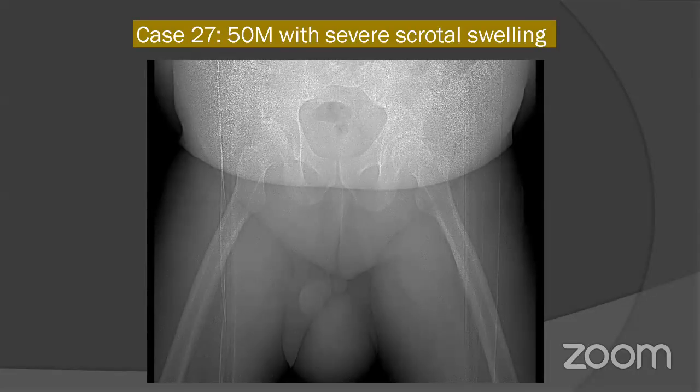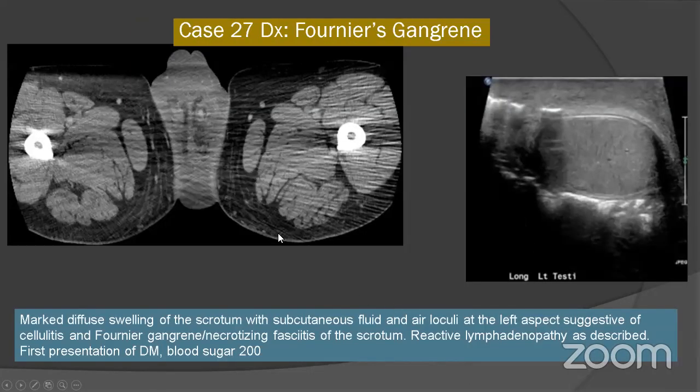And this is going to be my last case because I think it's going to be 9 p.m. soon. And this is easy. I already have some responses. I think you've already preempted my last case. This patient has severe scrotal swelling. I have the scout image and you can see some scrotal swelling, immense, and small lucencies in the scrotal sac.